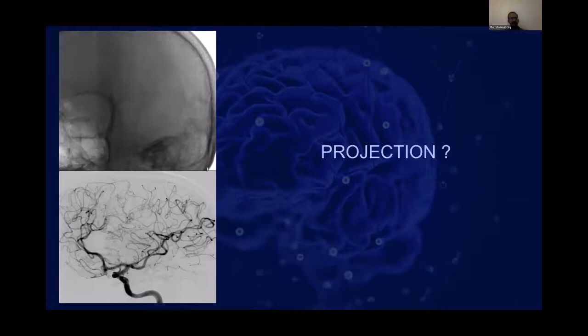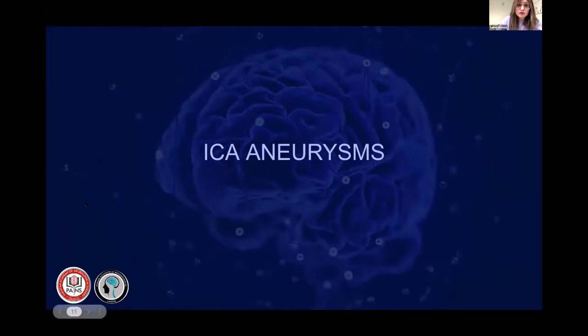It appears likely to be transorbital oblique. Yes, this is transorbital oblique, and we did the 45-degree inclination of the tube, and this is oblique, and you can see this orbit. The oblique position tells us this.